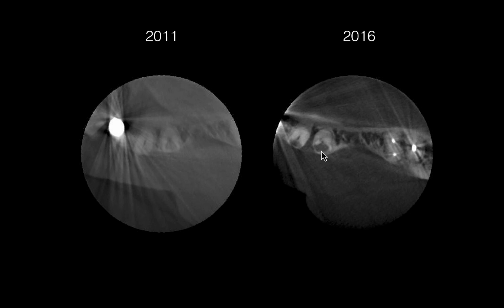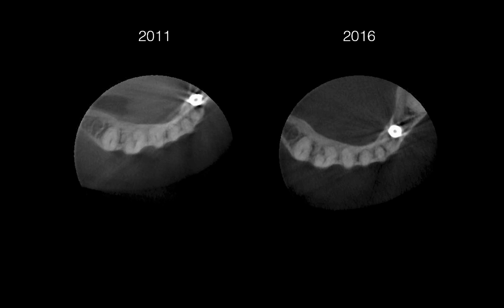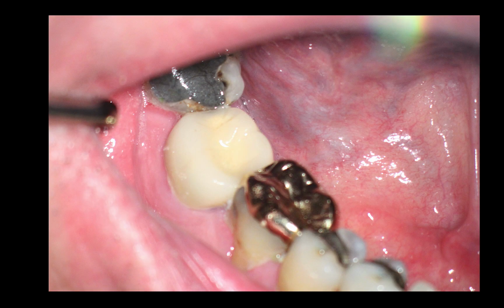There actually was swelling here. That's why she came back. That tooth needs to come out, tooth number 20. Tooth number 21 probably should come out too, and it might be time for her to look at some implants down here. As we look at the other side, this is now 27. 27 looks worse, but not much worse. These others, there really isn't any change. So I do think that leaving things alone isn't necessarily a bad option sometimes in cervical root resorption.